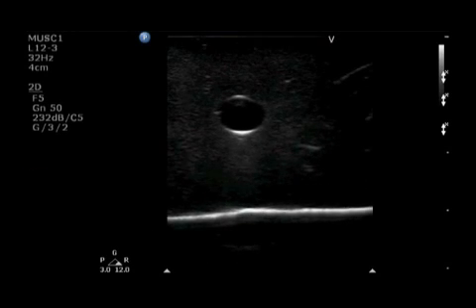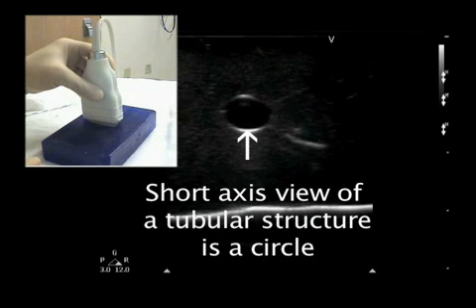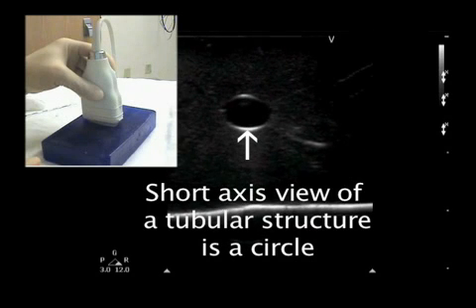We will demonstrate some of these principles by returning to our simulator, in which we are imaging a circular structure known as a simulated vein. The simulated vein in short axis appears as a hypoechoic circle indicated by the white arrow.